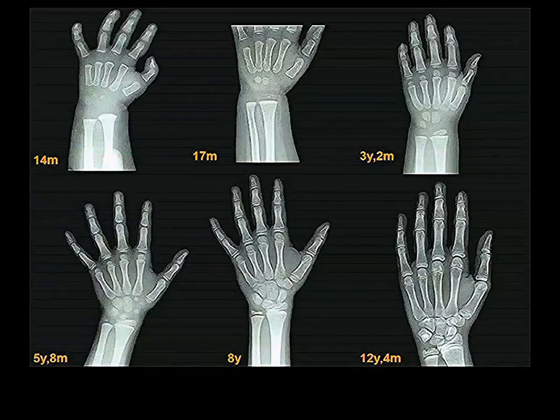Now, when you are born, all of those bones exist as little cartilaginous bones that look just like they're supposed to, but don't show up on X-ray because they're made out of cartilage. And eventually, one by one, each of those wrist bones develops an ossification center in the middle, which then spreads and turns the whole bone except for the surfaces where it articulates with other bones, and that's always done by cartilage. Articular surfaces are cartilage. Turns these things into bones.